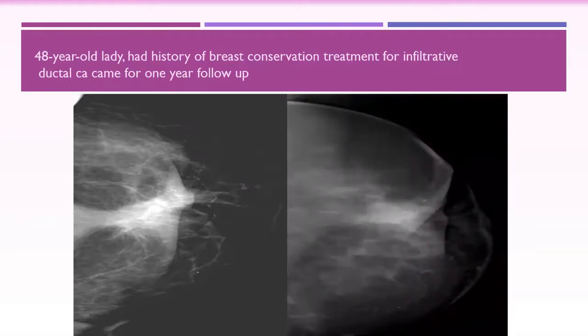So she had a surgery from the previous. You did not ask which one is the first, which one is the previous. The one on the right is the first one, and after that she did surgery and underwent treatment, and then she came like this.